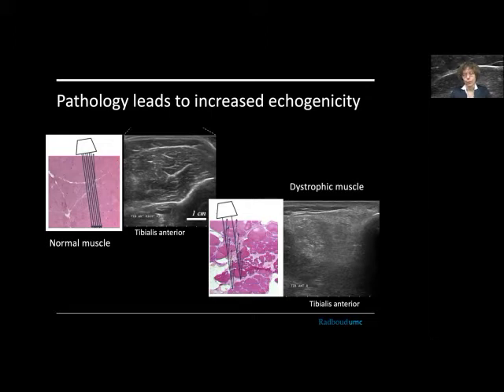And because the ultrasound is already reflected back in those top dense layers, not a lot of it will get through to the deeper layers. And that is something called attenuation. And both phenomena, so a very dense white muscle, attenuation, and then also that you can't really see the texture of the muscle anymore, these are the basics of muscle ultrasound imaging.